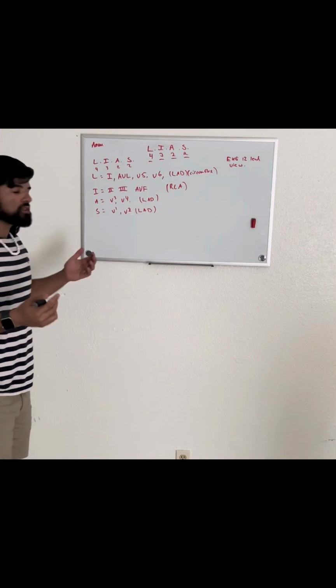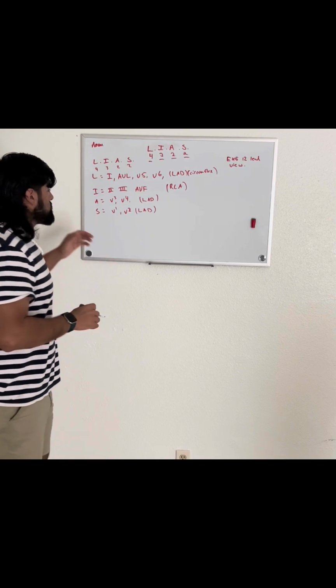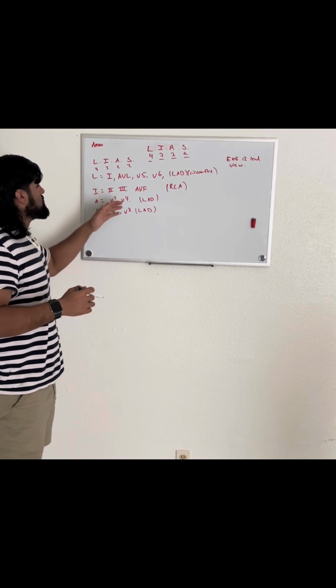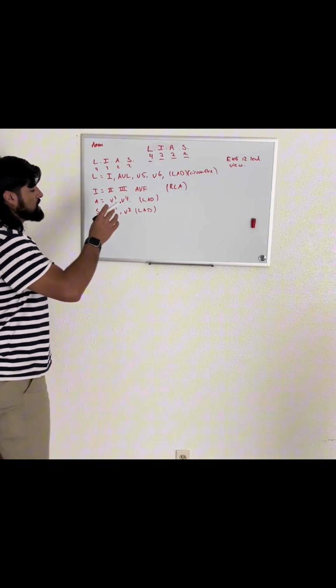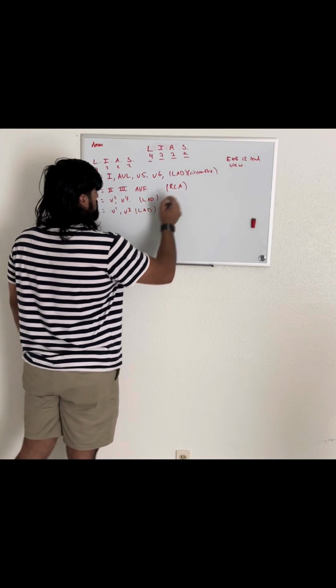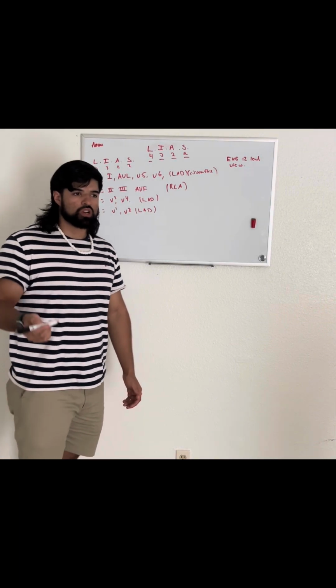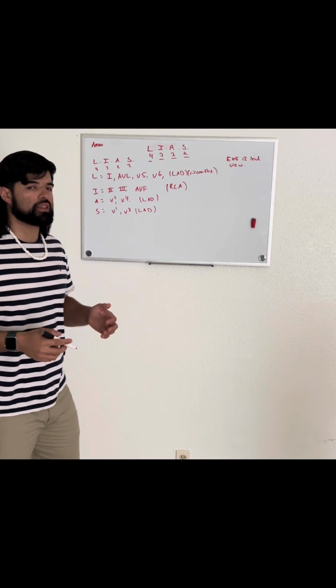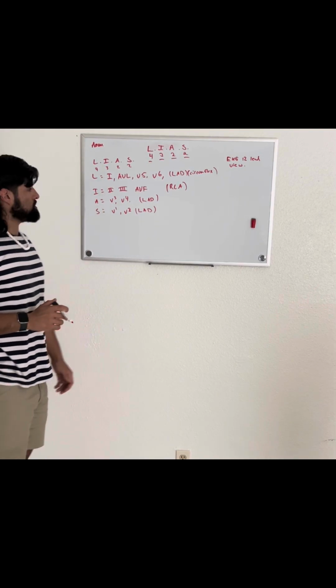So the next portion is going to be the inferior view. With the inferior view, we're going to think of leads 2, 3, and aVF, and the coronary artery that's related to it is the right coronary artery, right? So if we have any ST elevation or ST depression or any kind of ischemia, that's where we're going to be seeing it also, right?